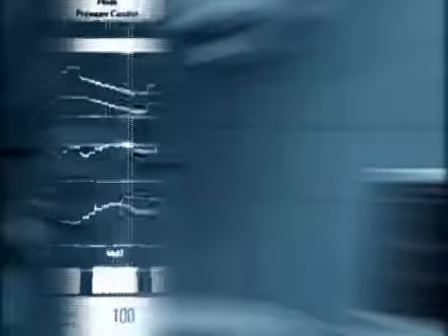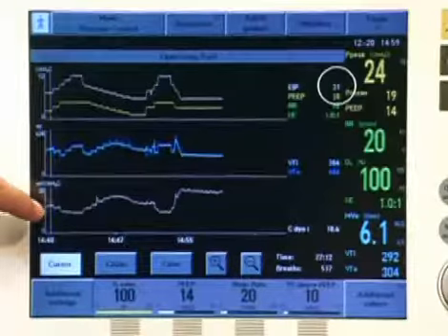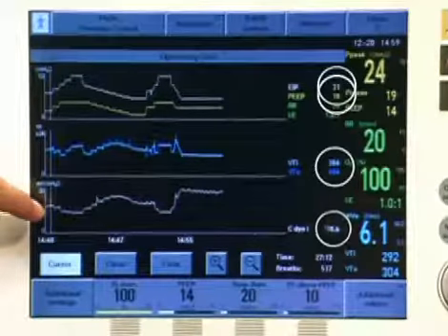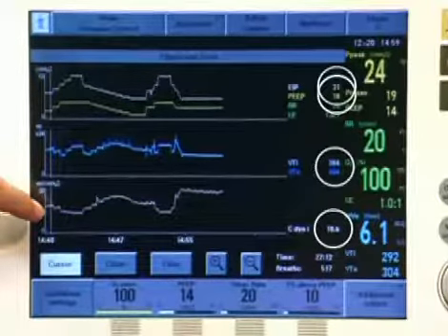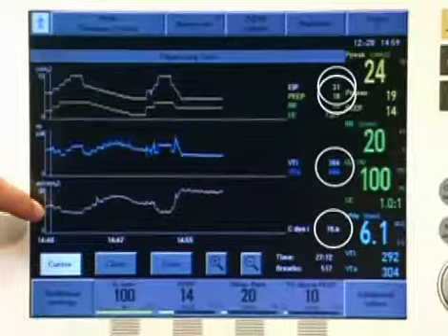The Open Lung tool is an online monitoring option that looks at the changes in lung mechanics during the clinical application of a recruitment strategy. On an adjustable timescale, airway pressures, end inspiratory pressure and PEEP, tidal volumes, and dynamic compliance are displayed after each single breath. The aim of this tool is to provide the clinician with a guide that can lead him through the complex process of recruitment and PEEP titration.